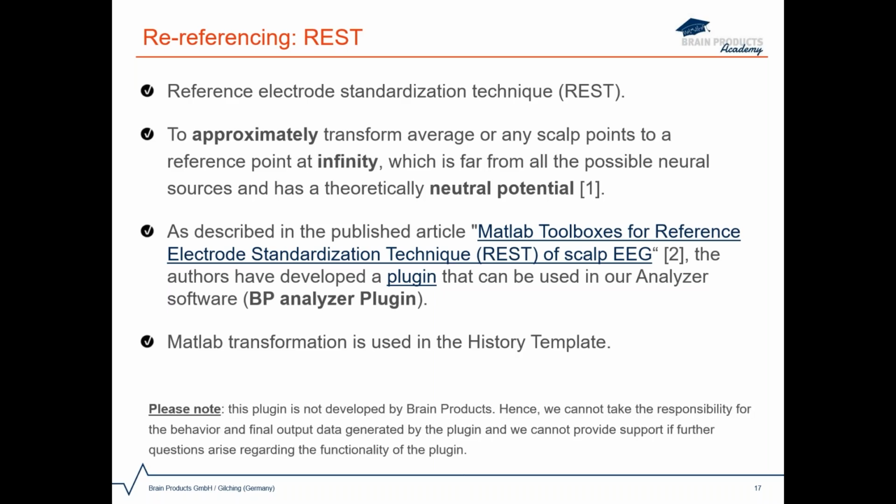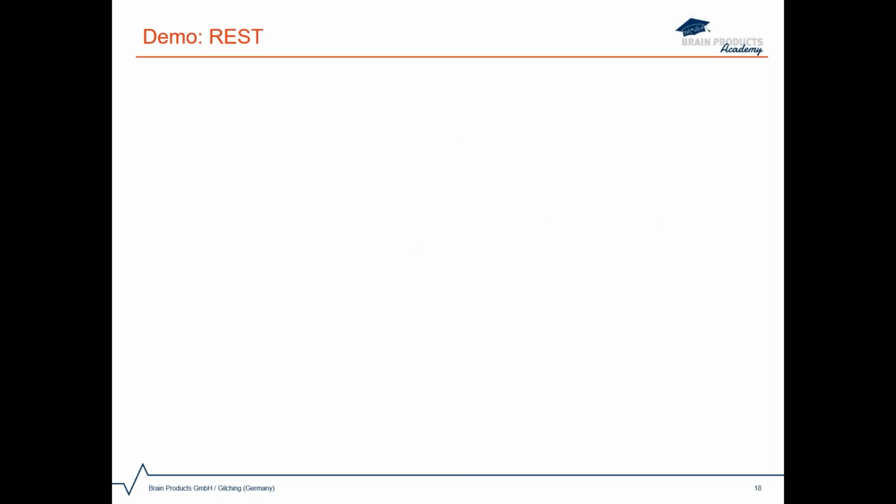Please note, this plugin is not developed by Brain Products. Hence, we cannot take the responsibility for the behavior and final output data generated by the plugin, and we cannot provide support if further questions arise regarding the functionality of the plugin. In this demo, I will show you the step-by-step procedure of how you can integrate the plugin into your Analyzer pipeline.